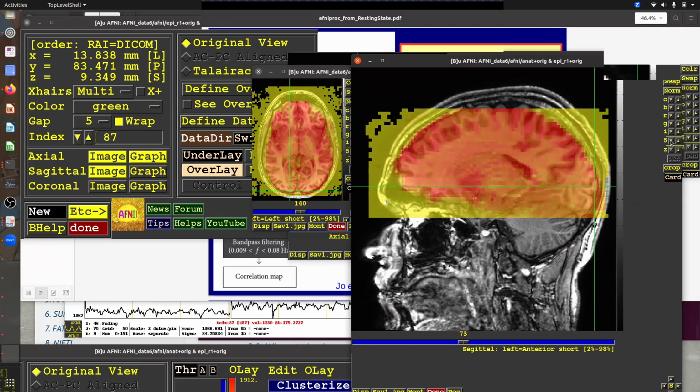They relax between scans, and it's fairly fine, but the overall edges are pretty good, but we can actually do better. So we can make sure that the subject's EPI, fMRI data is more well aligned to their own anatomical. Why do we do that?